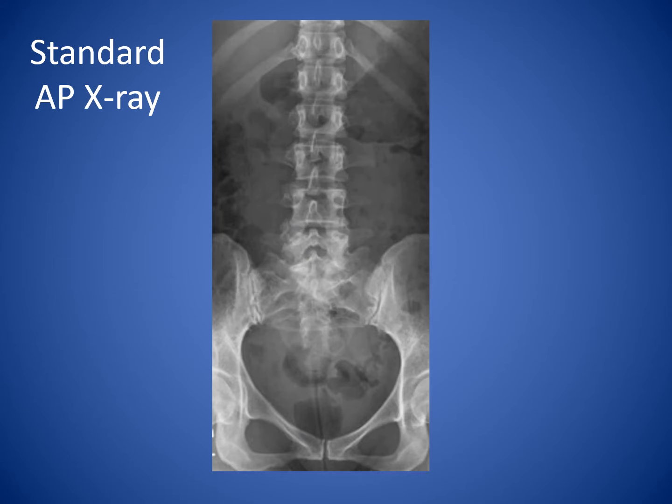When you have an X-ray, they're typically AP and lateral. They're typically also performed standing. It's helpful to know if they're standing or not. Sometimes there's a marker that's a level that'll tell you whether it is standing or not. But let's assume they're all standing.